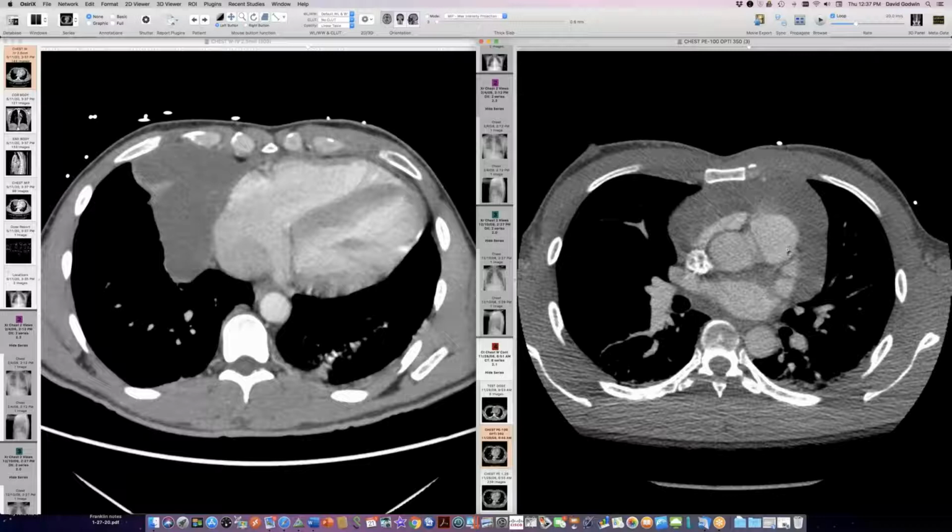Okay, and it has not been re-examined pathologically. So I view this as most likely a recurrence because it's a similar look, and it's adjacent to where there was an abnormality that looked the same before. Yeah, but we don't have a lot of intervening imaging to show a steady progression, and we don't have new pathology. But we'd have to invoke a second process to explain this new lesion if it's not just a recurrence.